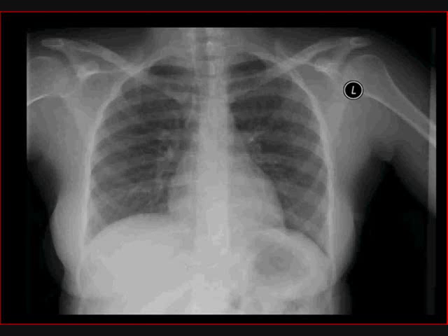Then I proceed to look at the lungs. Has there been a sufficiently large breath? To do that, I look to see whether or not there are 8 ribs that we see posteriorly, and in this case we do. Then we go on to see if there's any lung consolidation, any nodularity, or any abnormal interstitial markings. In this case, the lung parenchyma is absolutely normal.